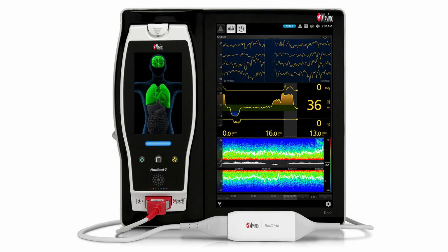Administering a medication based on the clinical response to pain and the depth of hypnosis becomes a promising future. Nociception Level Index, Bispectral Index, and SED line are tools that allow the anesthesiologist to assess the response to pain and the depth of hypnosis during a general anesthetic. These systems aim to modify the infusion of drugs in the event of a response, making them the future pillars of any navigation system.